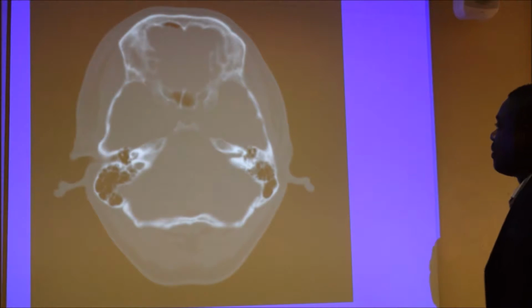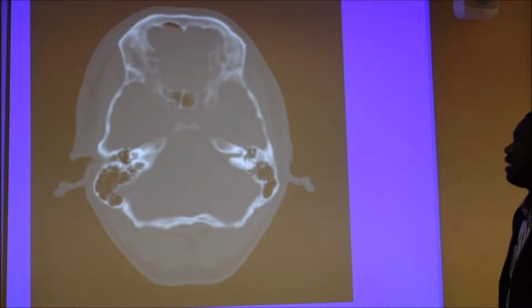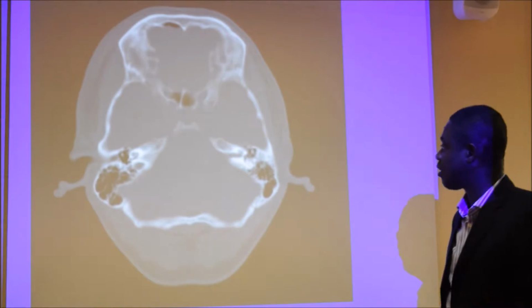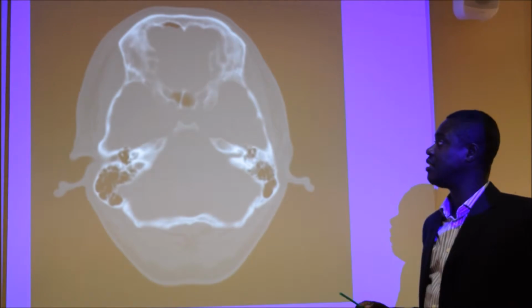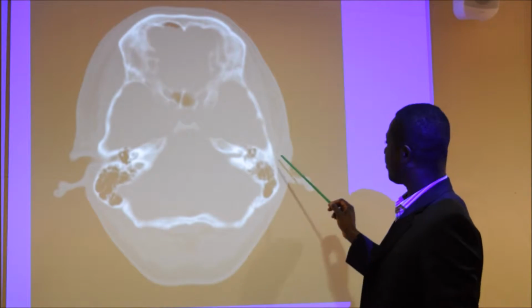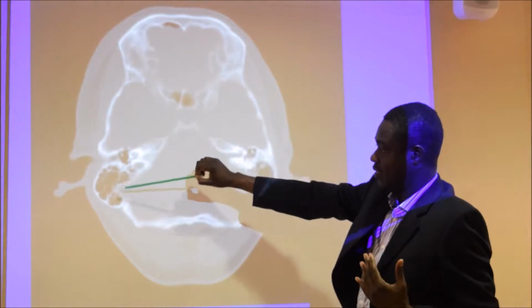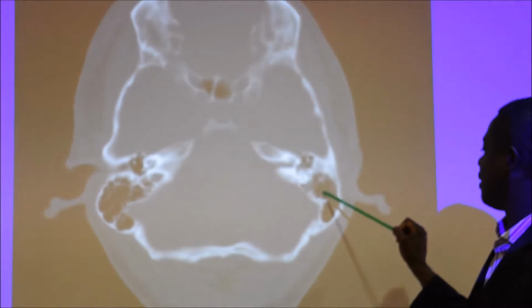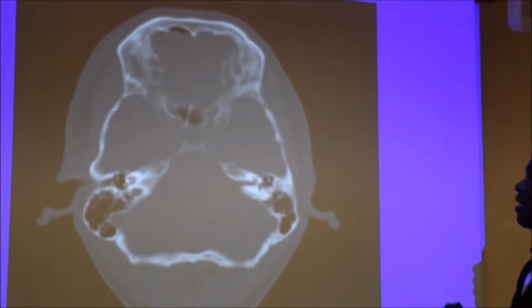So this is the sort of images that you're presented with in CT. And with CT, where in ultrasound we talk about echogenicities, in CT we talk about densities. So, this is just an axial section through a patient's brain. And the bright area there is obviously the bone, which is high density, shown as bright on CT, and air in the mastoid and sphenoid sinuses is shown as low density or darkness.